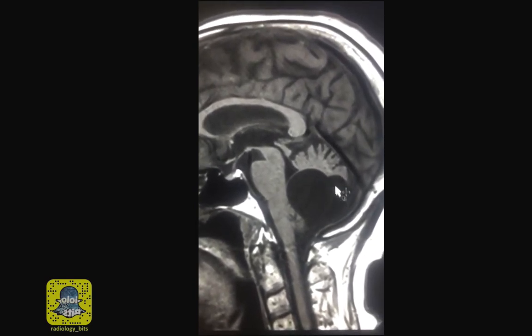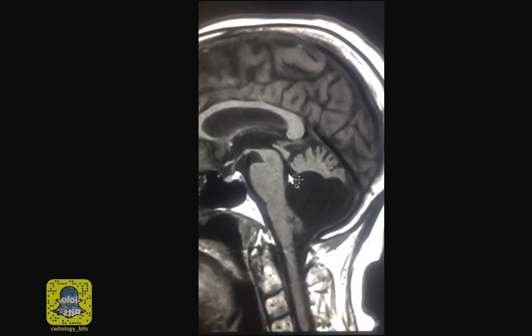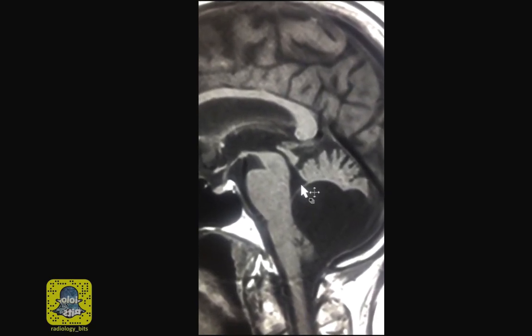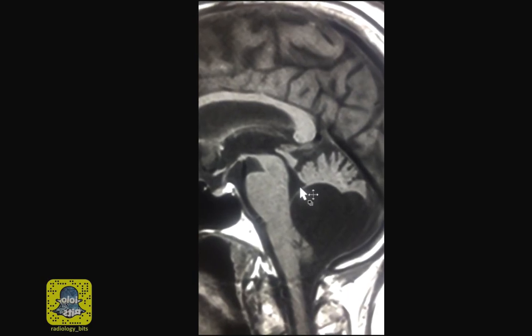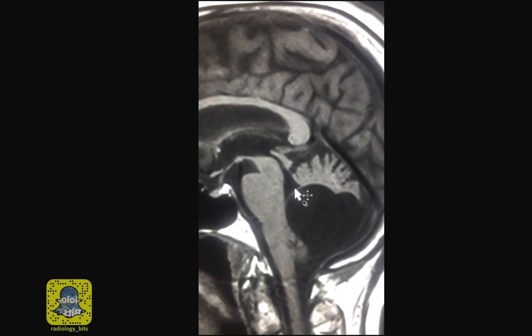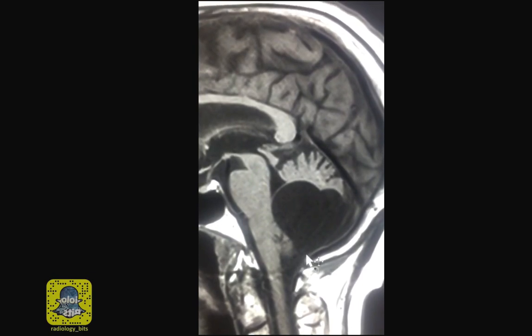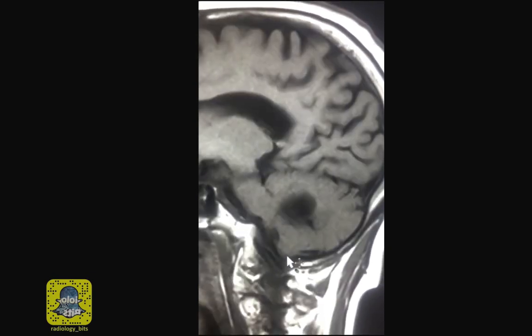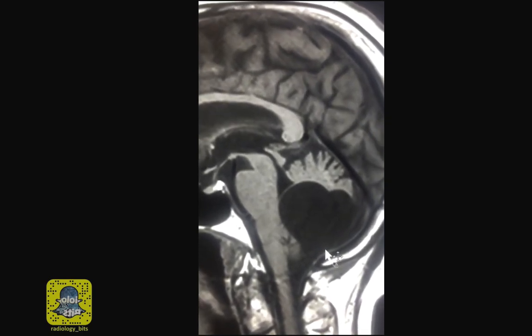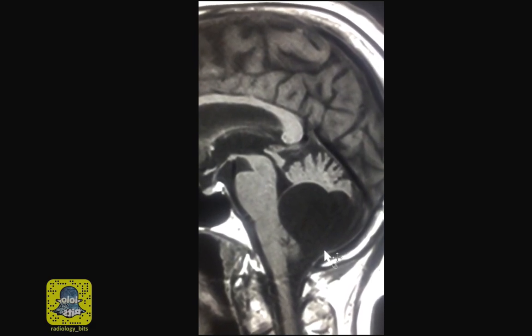If this was a Dandy-Walker malformation, you'd expect vermis abnormalities and communication with an expanded fourth ventricle. Although an epidermoid cyst could look dark on CT, MRI is useful since it would tell you that the fluid within is not as pure as you think, and an epidermoid would be bright or restricted on diffusion, which is a very helpful sequence for that. With mega cisterna magna, a normal variant, you'd have expansion of the CSF space posterior to the cerebellum. There is more to discuss with the Dandy-Walker malformation, and we'll leave that for another case in the future.